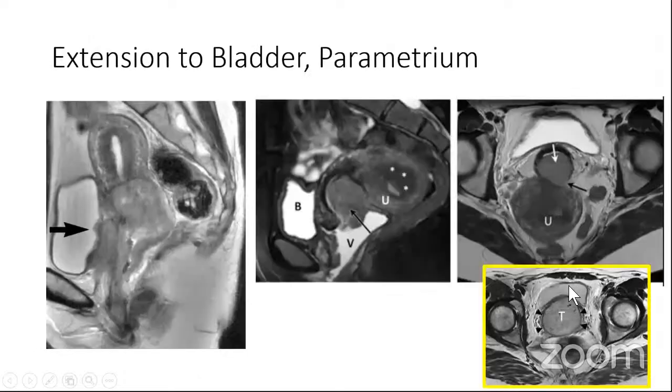And coming on to finding a bladder invasion. So obviously you can see the dark ring, as we discussed in the first picture of an MRI. The dark ring is preserved in the upper part and quite preserved in all the other areas. Of course, this area seems to be a little bit hazy. And in this anterior part of the mass, this is a sagittal scan, so anterior part of the cervical region, you can see some loss of that ring, which suggests bladder invasion.